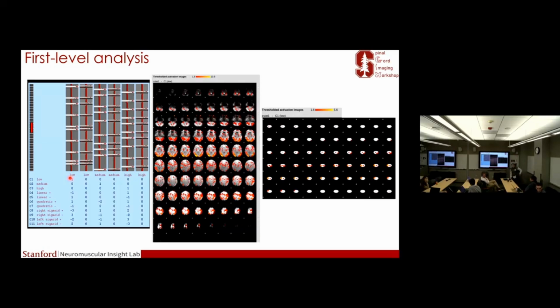I did consider that. Do you do brain extraction as well? And for the structural, that's to get the functional brain mask. And that is also brain extraction. Yes, true.